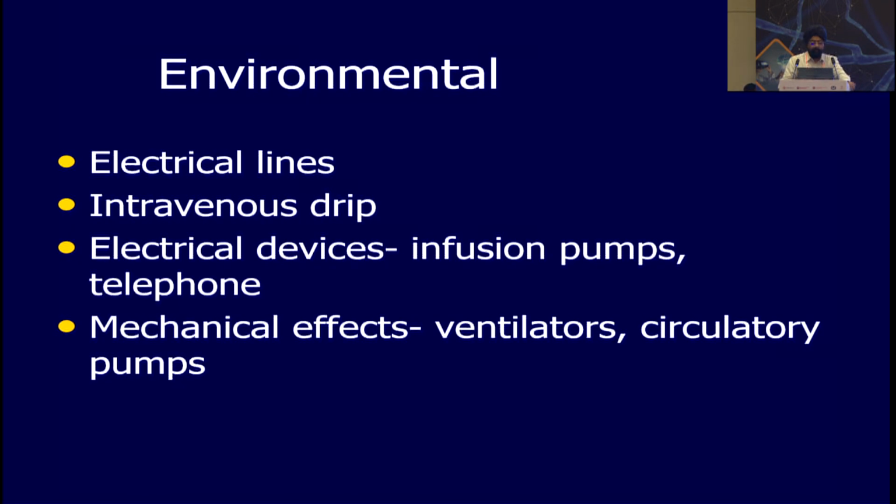Environmental artifacts: any electrode which is kept open, especially in ICUs, you have a lot of electrical lines going on, IV drip, ventilators, so many other doctors are moving around, phones are there, mobile phones, other phones. So everything can be picked up in this environmental artifact in ICU especially.